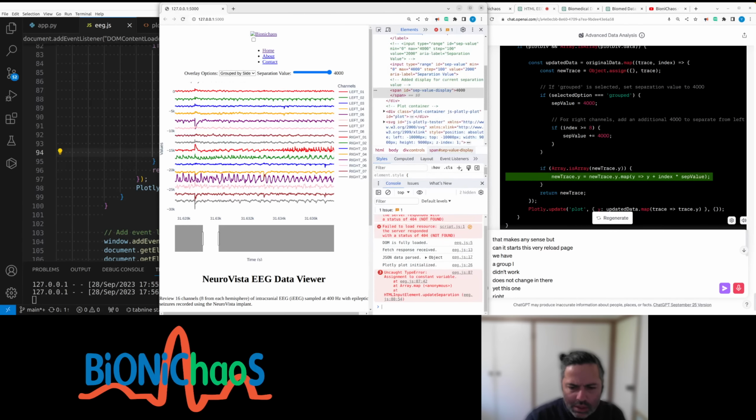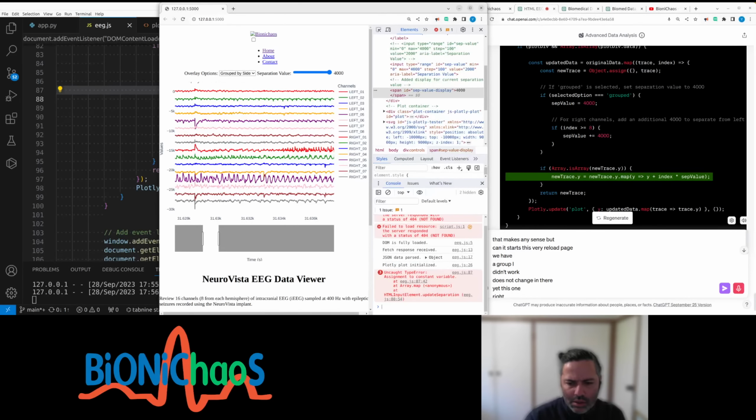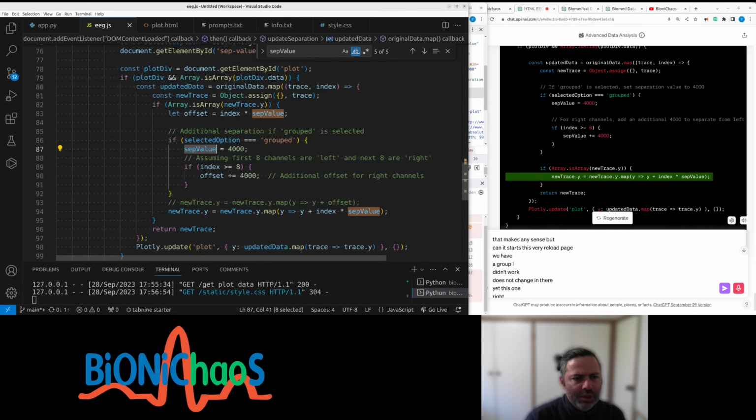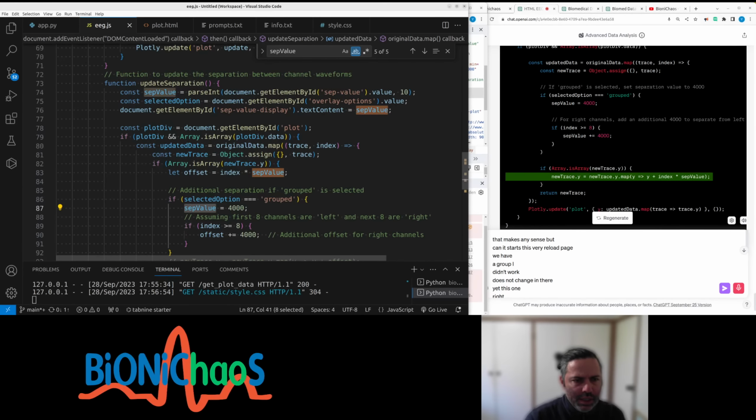Is that A7? It's a constant value. Separation value display.